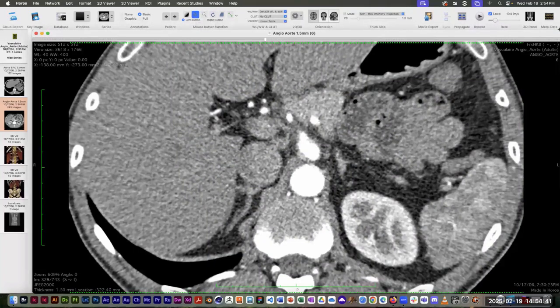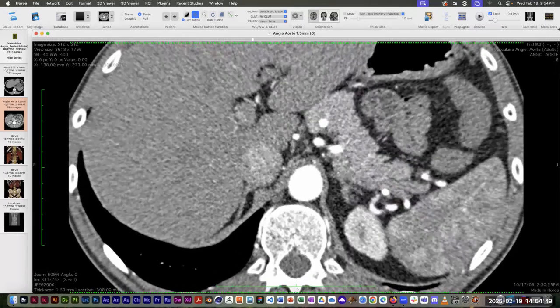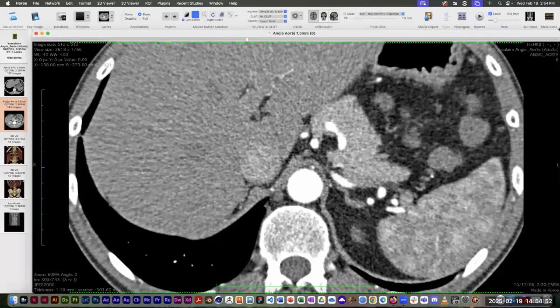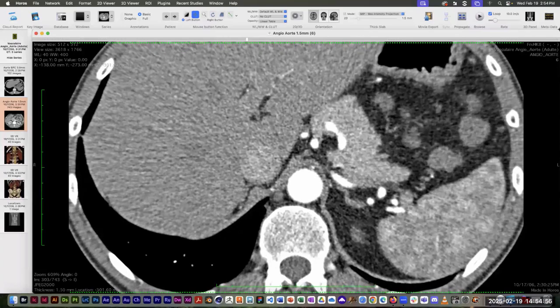And that still doesn't work either. Very weird. All right, I got to go back to the very first slice where I started to see the very top of that kidney. There's this little faint spot down here. That's the spleen at the bottom right of the image. And we're just starting to see a little tiny blotch of kidney show up.